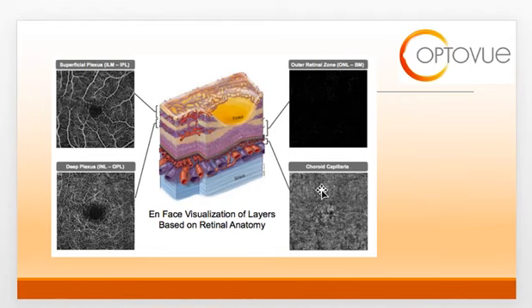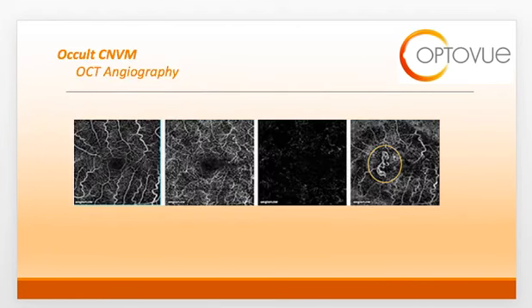to choroid. This is important because when you're delineating a type 1 choroidal neovascular membrane from a type 2, it's going to affect these slabs differently. Let's move on and discuss how. In a type 1 membrane, I mentioned before that the abnormal vasculature originates in the choroid. Thus, you can see that this abnormal frond of tissue is originating in the choroidal slab.